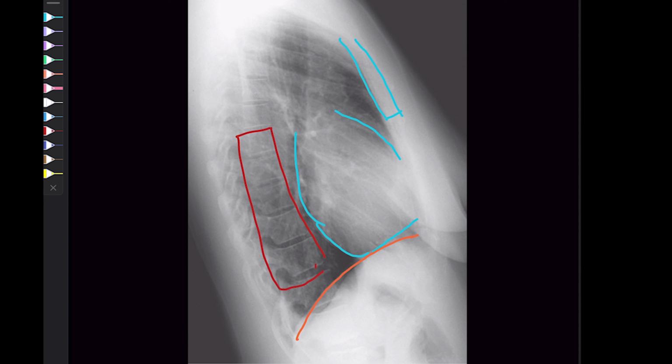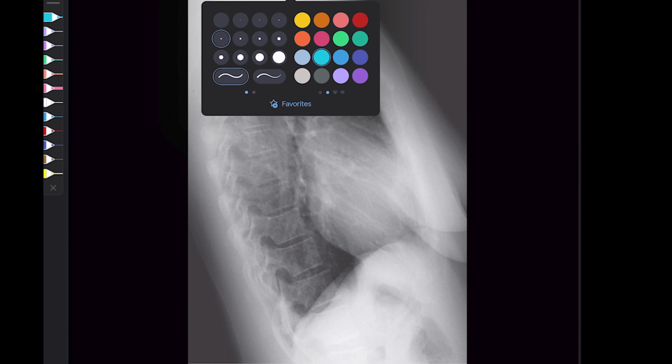This is my vertebral body. So this is a broad organization. So let's start working on this one by one. What are we looking into in this lateral view? Lateral view is really important, and there are 5 key areas. What are these 5 key areas? These 5 key areas are, let's start.